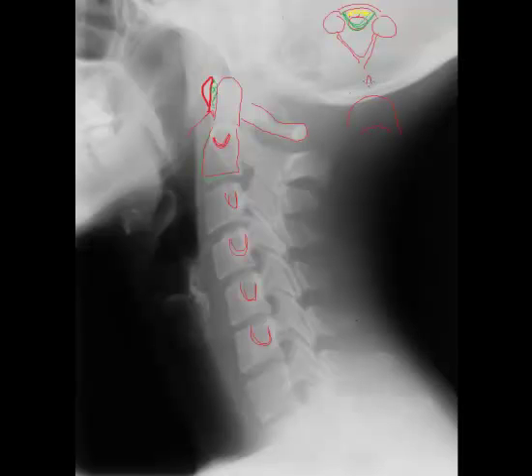Here's another bird's eye view drawing. This is anterior, this will be posterior. Here's a vertebral body, pedicles, articular pillar, lamina, spinous process. So when we move from anterior, first comes the body, followed by the pedicle, followed by the articular pillar, lamina, spinous process. Once we go back to the projection, we'll notice that the most anterior structure is the vertebral body. Now the vertebral body has superior and inferior end plates to which the intervertebral disc attaches. Now when we think about what comes next, the pedicle.